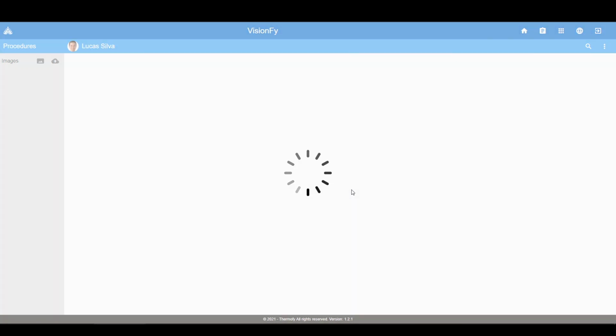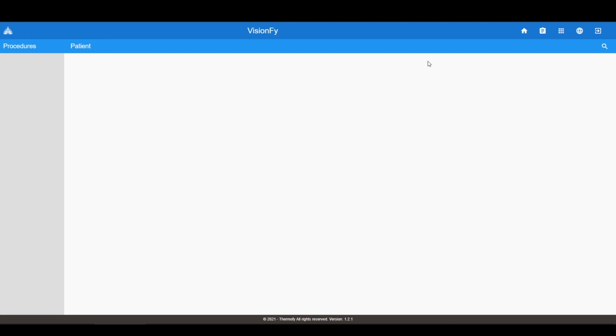This ends the tour of the main functions of VisionFy. Thank you for your attention.